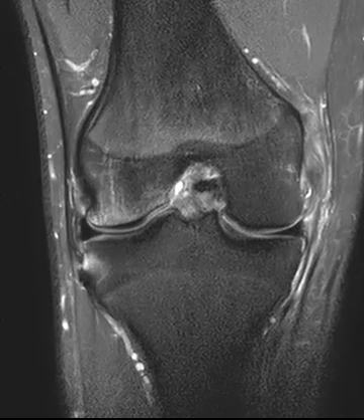Hello, this is Dr. Gay from First Lake MRI, and this is an 18-year-old male with a recent injury, knee pain, and he has a very common mechanism of injury.